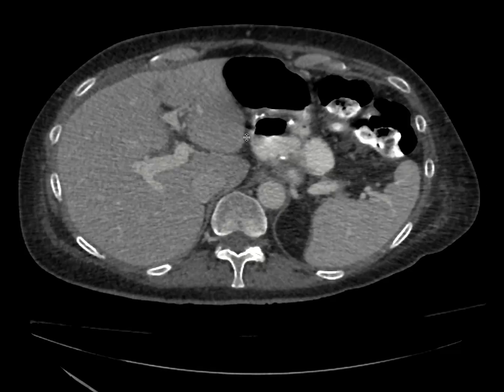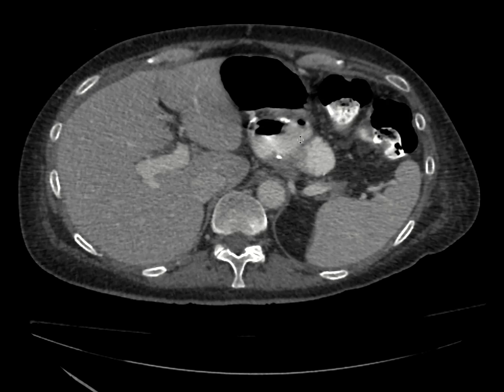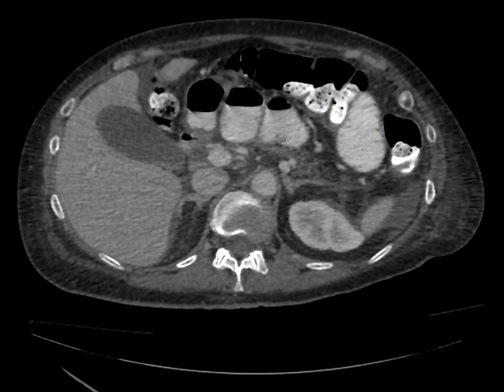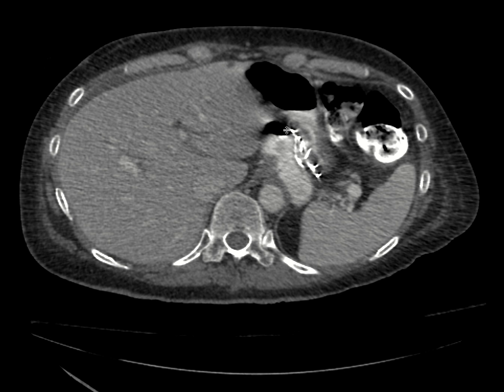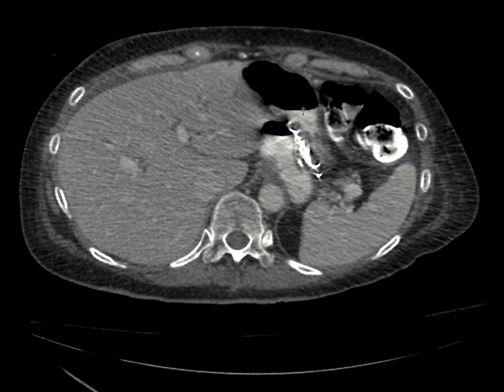And we can see within the excluded portion of the stomach, there's actually contrast, high density material within the excluded portion of the stomach. Now, if this is completely excluded, we shouldn't have oral contrast within here, and so this implies that there's a gastrogastric fistula. Oftentimes you can have breakdown of the suture line, and then you can get fistulization here, and contrast can be seen in both the gastric pouch and the excluded stomach.